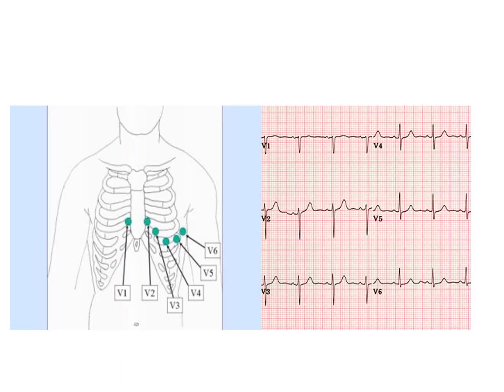So let's look at the precordial leads of this normal ECG. Okay, we will see, as we discussed just before, that lead V1 is completely negative. This is because the electricity in this particular ECG is going in its usual direction, down, left, and away from the chest wall, and lead V1 looks up, right, and towards the sternum, towards the chest wall. Now lead V2 starts to look leftwards, so we see a little bit of positive charge.